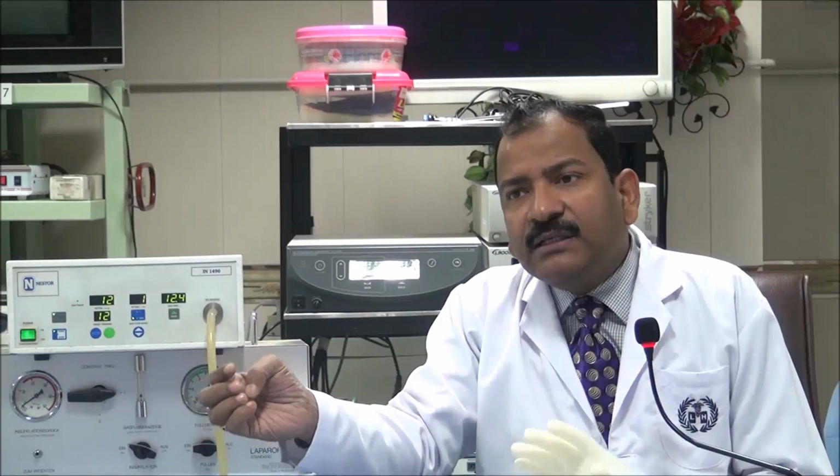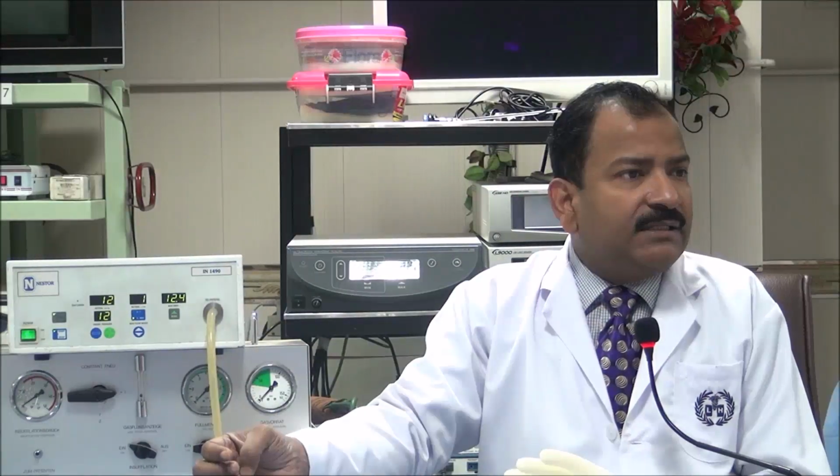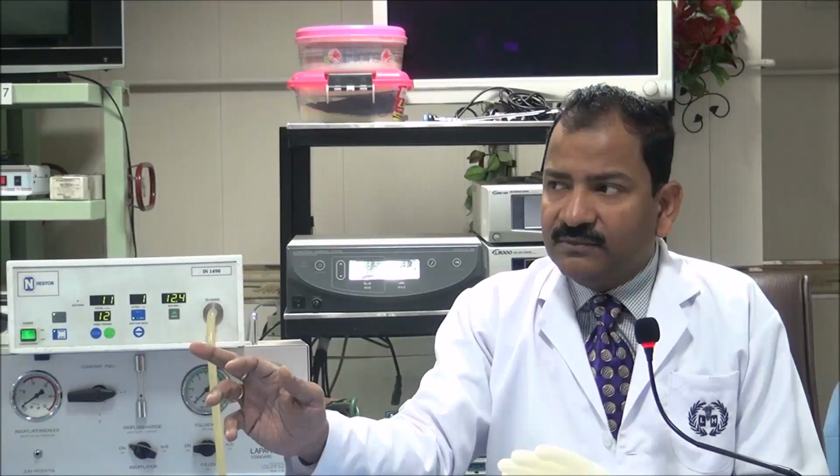Bowel also will come, that is also a question. So if it goes to the muscle septa or into the subcutaneous fat in an obese patient, after 200 ml the flow will stop. It will not keep on flowing slowly, because those are not stretchable like the glove or the peritoneum. So there is a limit. After 200 ml it stops.